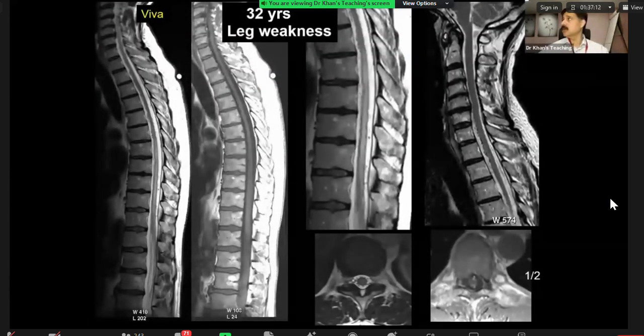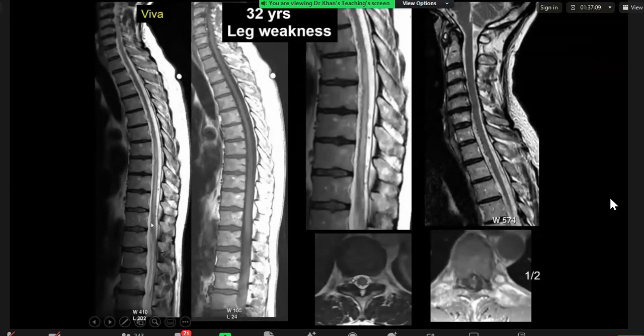Okay, over to you. Okay, so look at this cord, what is happening?